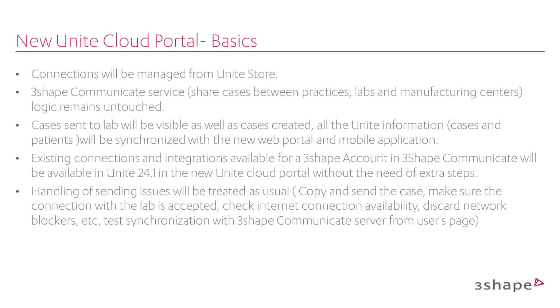Cases sent to the lab will be visible, as well as cases created but not yet sent. All Unite information, including cases and patients, will be synchronized with the new web portal and mobile application, regardless of whether they were sent or just created and scanned.